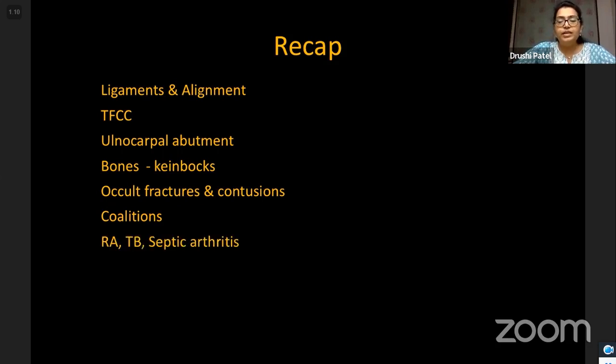When there is presence of synovitis, think of rheumatoid and chronic infective etiologies. Synovial biopsy helps, history helps pinpoint the diagnosis, serological markers help. Septic arthritis, one way to differentiate septic arthritis is taking additional diffusion weighted images.